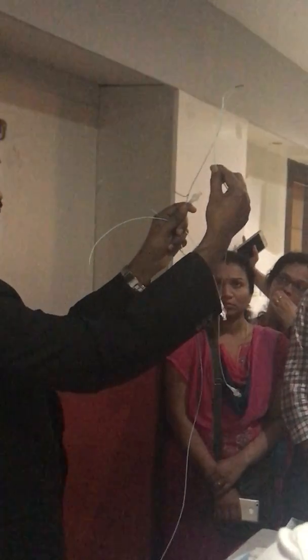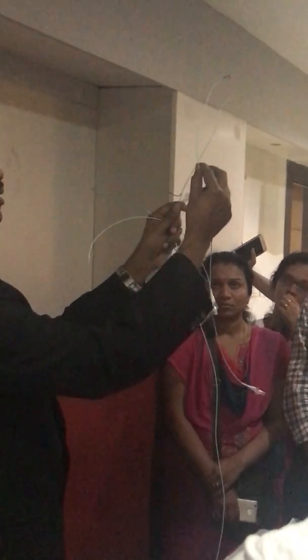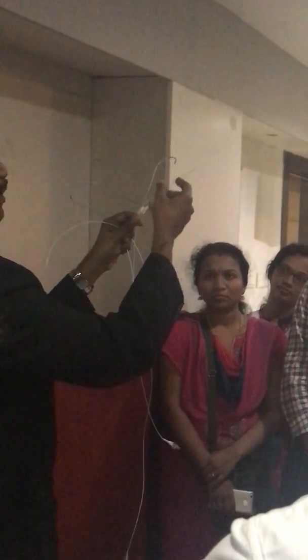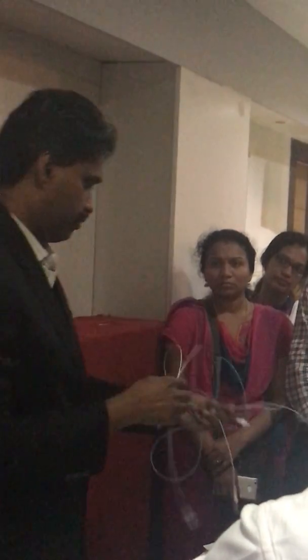This is cobra, and this is headhunter. Got it now? The difference? Cobra will be more acute than the headhunter. Headhunter is used for the 4 vessel angio, which will be a little more straight, whereas the cobra is used to cross to the opposite side from the iliac, so that will have a much more acute curve.